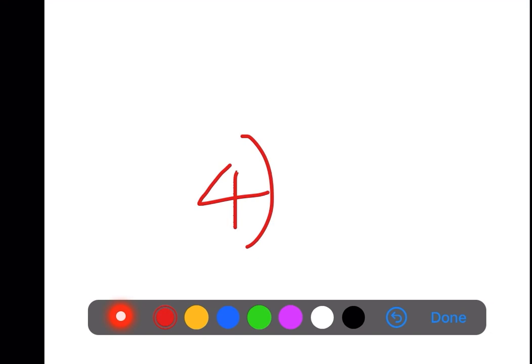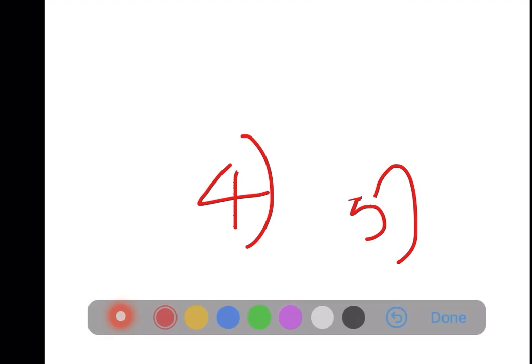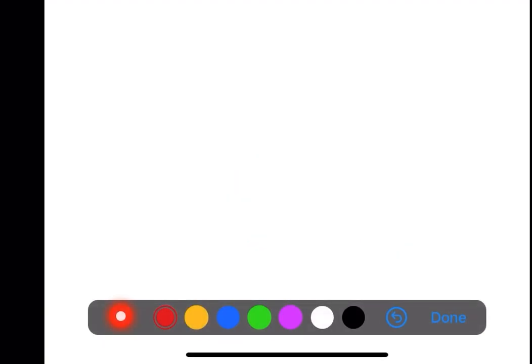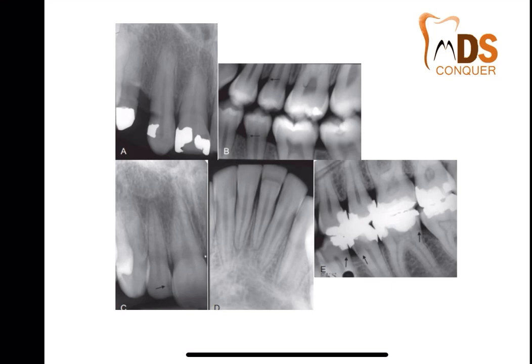And the final step is that you have to formulate your radiographic interpretation, and finally make your report. So the fifth step is the formulation of your radiographic interpretation. First step, localization. Second step, assess the periphery. Third step, internal structure. Fourth step, effect on the surrounding structures, and last is the formulation of your radiographic interpretation. Right, now let's discuss dental caries.